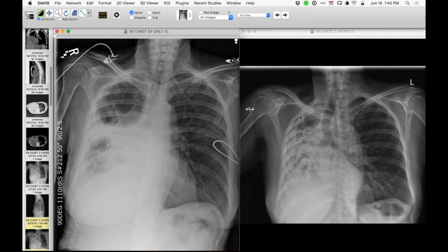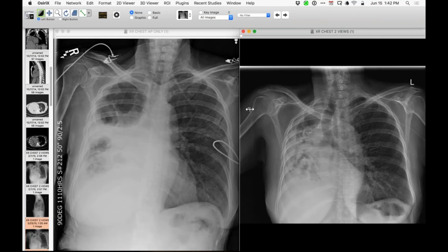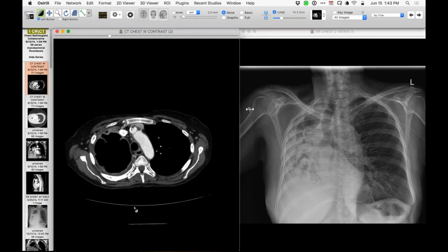So the context is severe tuberculosis with progressive scarring of lung, disappearance of lung parenchyma effectively or mostly, leaving the patient with bronchiectasis that you can see there very nicely. So this is interesting from the point of view of this. Let me bring up the CT and get my bearings again.